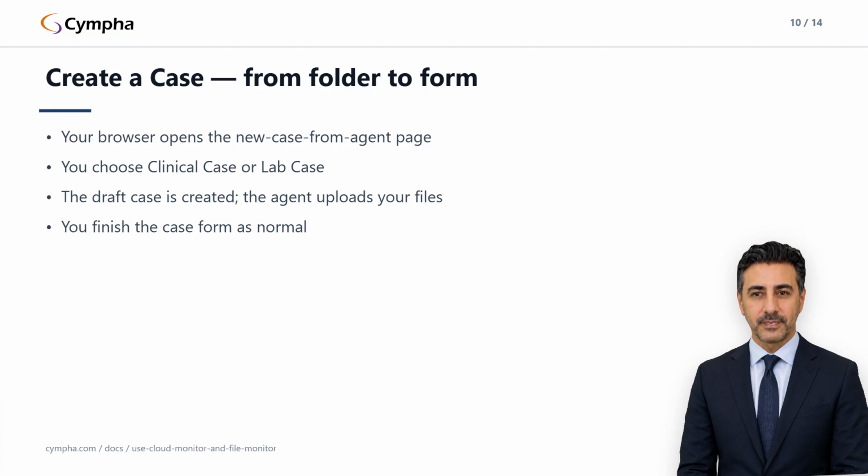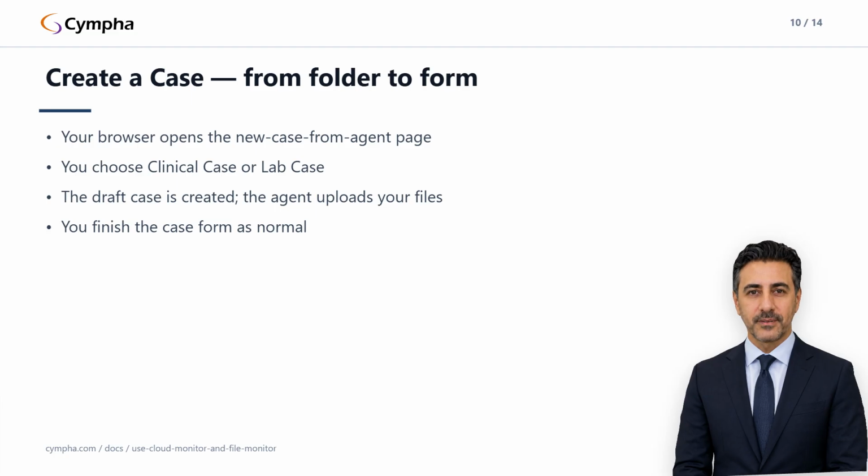The agent then runs its Upload Worker page to transfer the selected files onto that case, and from there you fill in the rest of the case form exactly as you would any other patient, lab, category, parameters. Notice how the labor divides. The agent handled the part computers are good at, moving the right files onto the right case, and left every judgment to you, which is a good moment to state File Monitor's boundaries as plainly as the written guide does.